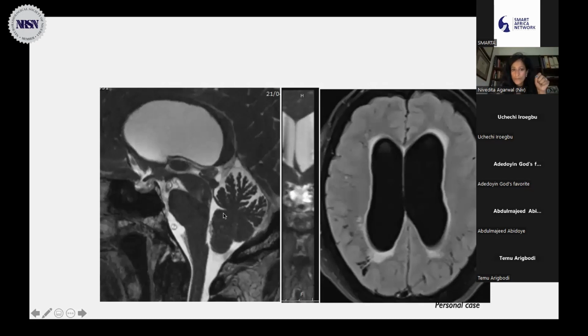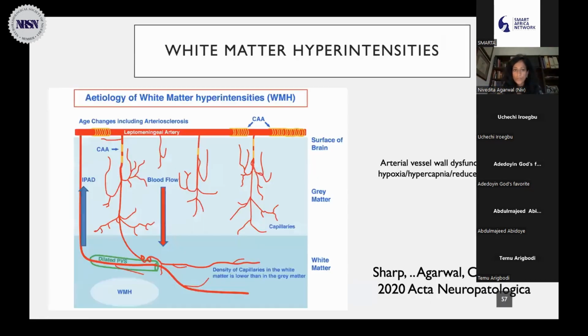For example, this is a patient with bilateral obstruction of foramen of Monro. And as you can see, she developed an obstructive hydrocephalus, very simple, transependymal transudation edema, very simple. And you can see that some of the perivascular spaces have enlarged here. So there is a difference. There is something going on with the movement.